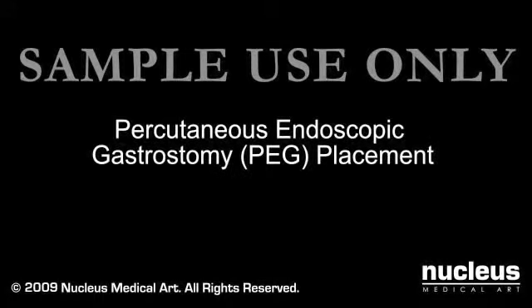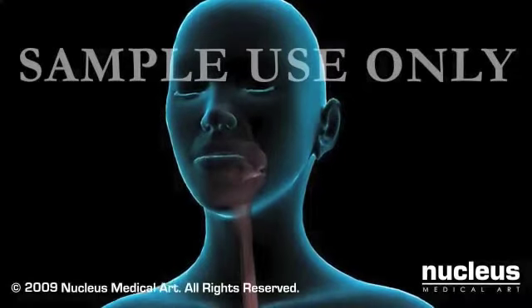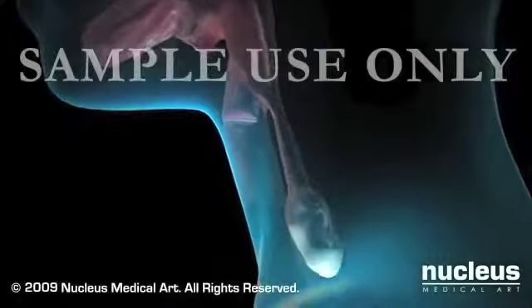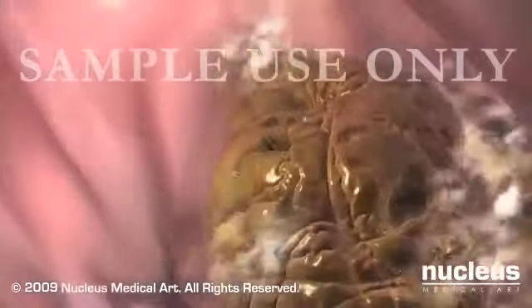Your doctor may perform a percutaneous endoscopic gastrostomy, or PEG, to insert a feeding tube into your stomach if you are unable to take food by mouth for an extended period of time. Digestion of food begins in the mouth. When you swallow, food is pushed down into your esophagus, a muscular tube that carries food to your stomach where it is digested.